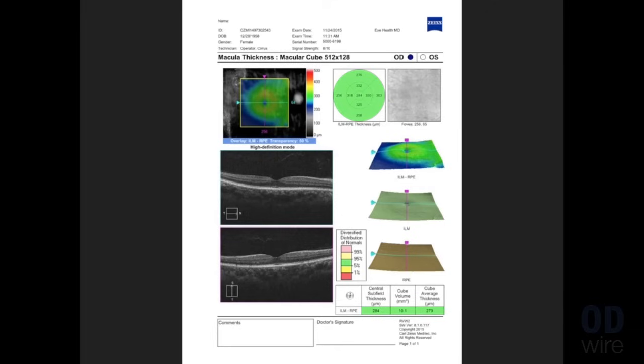Here, you have a standard report from a ZEISS OCT device, and this standard report provides a lot of information. I'd like to break it down for you into its components. Let's begin with the qualitative analysis that can be seen here in both the horizontal and vertical images, and you'll find those corresponding parts within the navigation lines that you can see overlying the map.